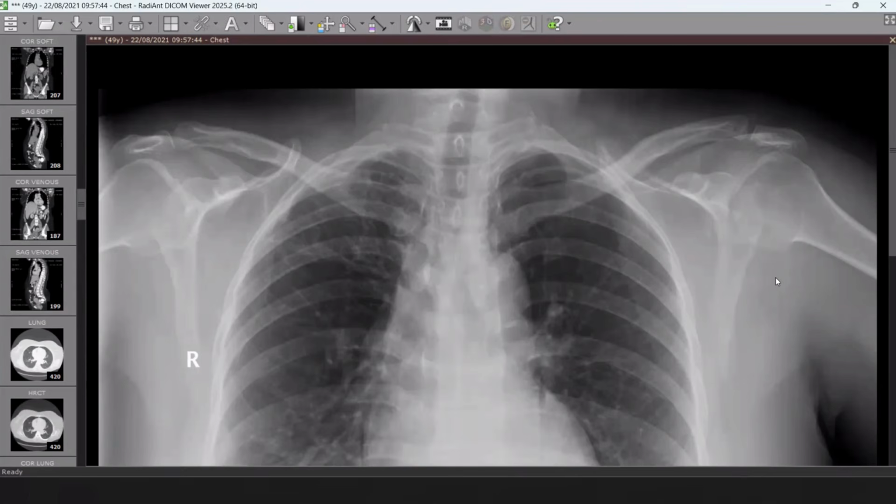Since the patient is presenting with shortness of breath, with no evidence of fever, I would be thinking along the lines of cystic lung diseases with preserved lung volumes. Okay, but if we have cystic lung disease, it will affect most of the lung fields, is that correct? But this one is localized at the right apical lung zone. Yes, fibrotic infiltrates with cystic changes. Do you have any other options? I can also think of bronchiectatic changes. Okay, yeah, you are right.